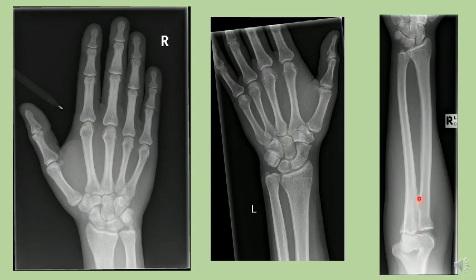Here you can identify radial tuberosity, head of the radius, the lower broad end of the radius, the lower narrow end of the ulna. One more thing you can easily identify here is the medullary cavity. Compared to the whole bone, it is a little radiolucent, but the borders of long bones are denser because these are cortical bones, compact bone. Because of the medullary cavity, it shows some lucency, radiolucency.